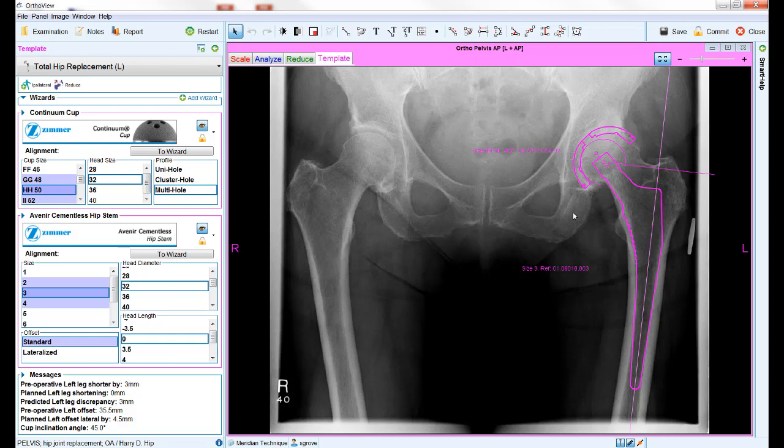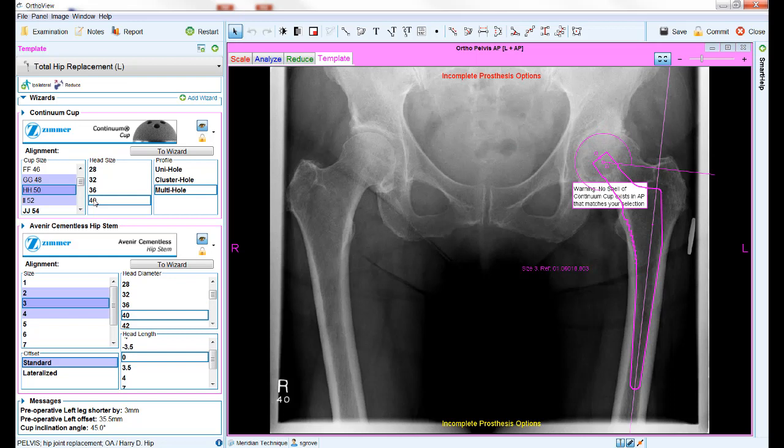While you are able to pick any value from the largest to the smallest in the settings on the left hand side, there may be some restrictions imposed on your choice by the implant manufacturer. Materialise OrthoView will highlight these restrictions using different font types. The bold or dark font indicates valid choices. The lighter or non-bold font indicates invalid choices. If an invalid option is chosen, for example a size mismatch, the template in question will disappear and a warning message will be displayed in its place.